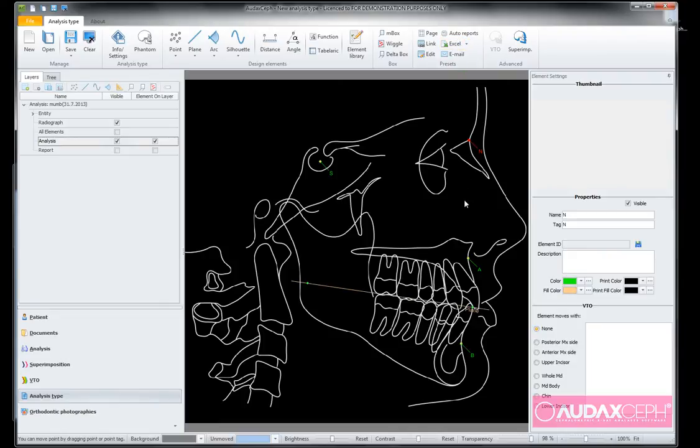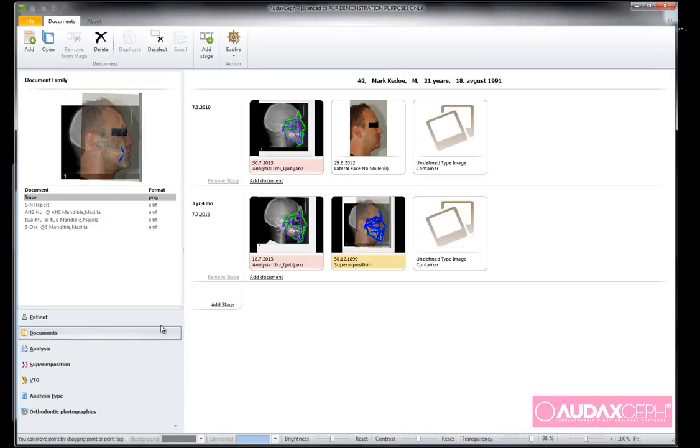One thing that I do now is I'm going to save this, and now I would like to go to the documents.